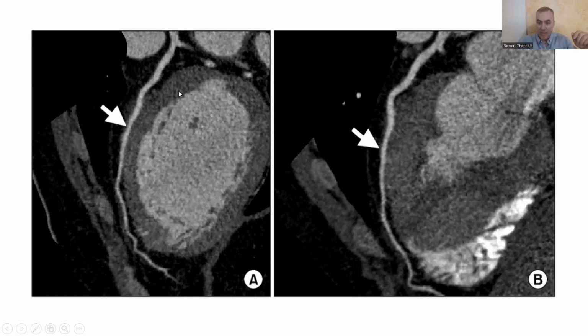It disappears. And then especially when you see it reappear later on down here, that's when you know that middle section is all bridge. So where the black is gone and you just see artery and then gray heart muscle, then you know that's the bridge right there.